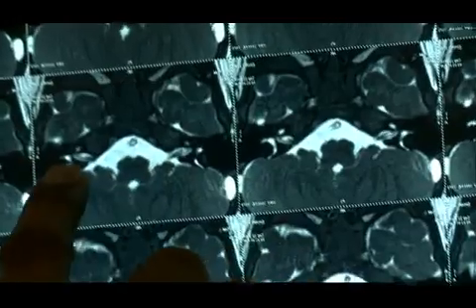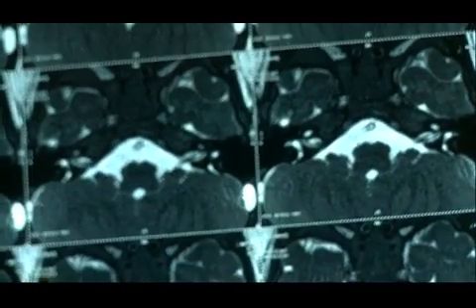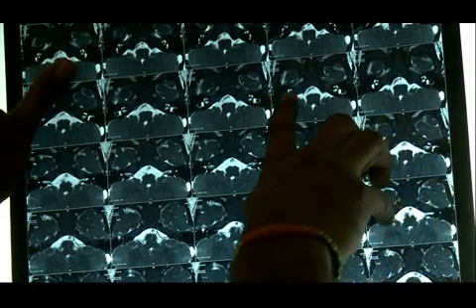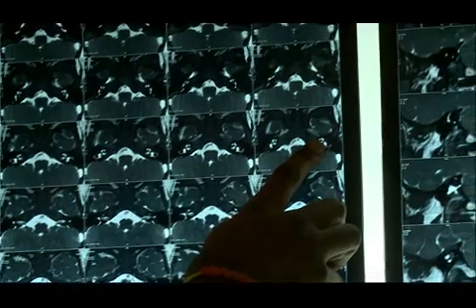Yes, this is a better MRI. We are coming from above downwards. Here, now see the vestibulocochlear nerves on both sides. Can you see? Now in the internal auditory meatus, the superior group of nerves are what? Anteriorly the facial nerve, posteriorly the superior vestibular nerve. And the inferior group of nerves are anteriorly the cochlear nerve, posteriorly the inferior vestibular nerve. See the turns of the cochlea with the intensity of fluid in the T2 weighted MRI.